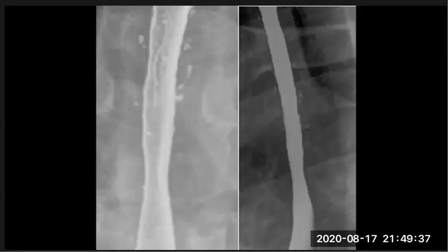You can mention the full name of the pseudodiverticulosis, but you should put one word before it. It occurs in reflux esophagitis. This is one of the causes, yes. It is intramural pseudodiverticulosis, okay? Intramural.